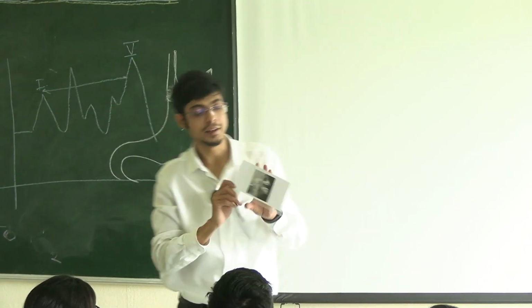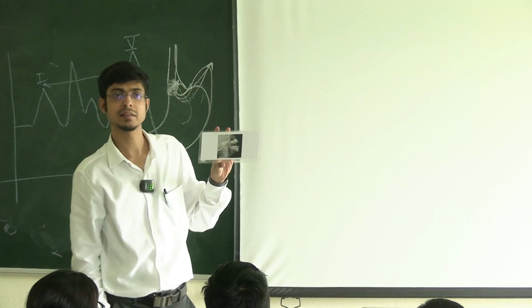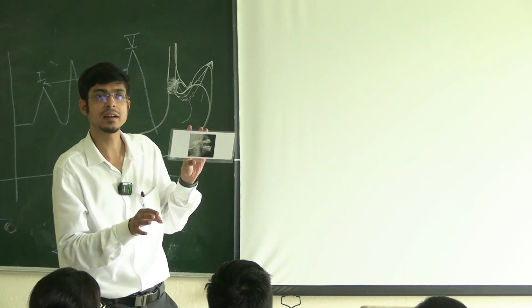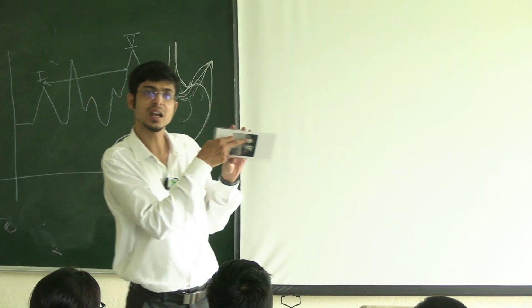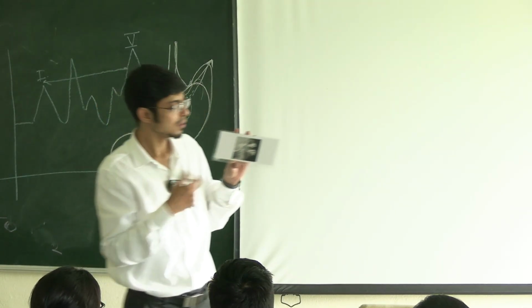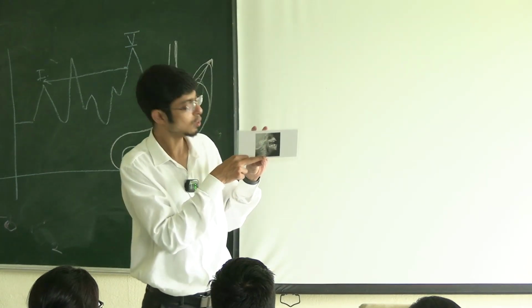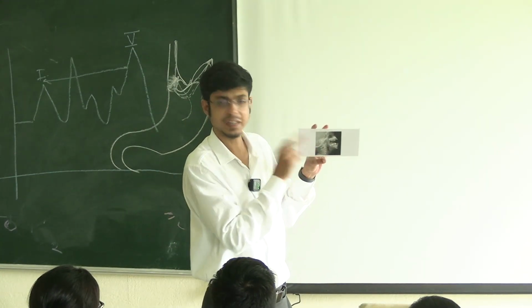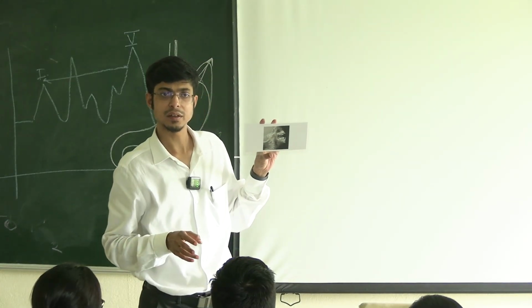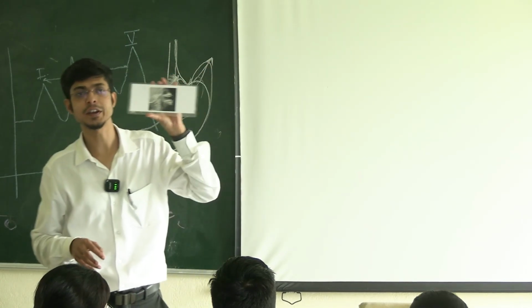At the first think of it. See, if I had to see an abscess, then I would have taken the nose in the X-ray. If I had to see the abscess in the neck, would I have taken the nose in the cut? No, I would have taken the throat only, in the neck only. So I have taken the nose, nasopharynx, and the upper part of the oropharynx maybe. Not even the larynx is here. So we have not gone into the esophagus. Okay. So this is a lateral X-ray of the soft tissue nasopharynx.